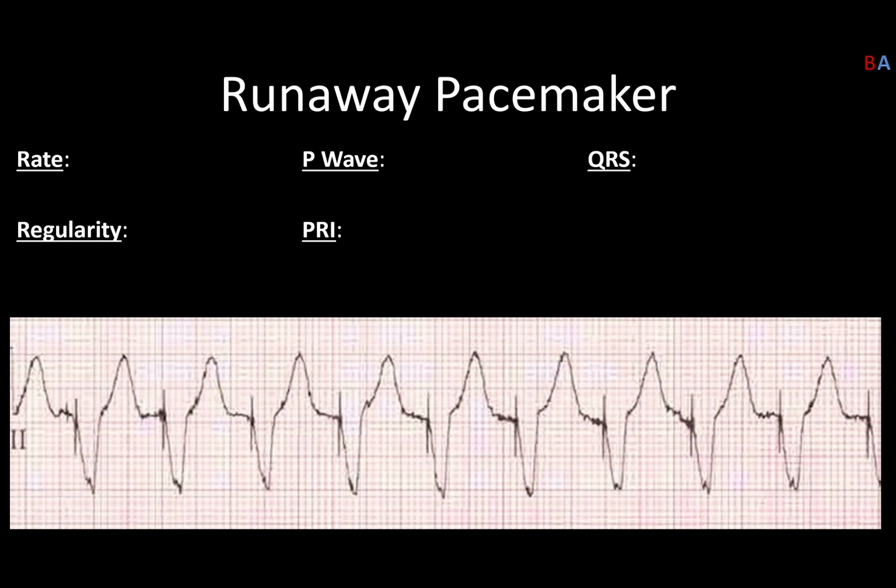If I measured these out, from here, the start of the pacemaker spike, to the next one, you get right at 13. And that gives you a rate of 115. Not terribly tachycardic, but it is. Runaway pacemakers can run rates up in the 140s, 150s. They can be very, very high. So it's important to keep in mind that there's a lot of different factors going on here, but for this case, it's tachycardic, and let's dig through it.